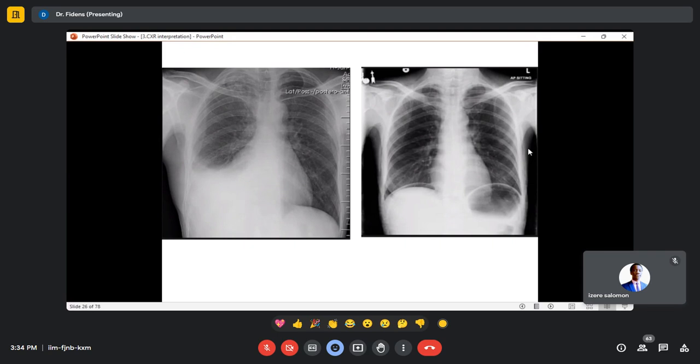under the diaphragm. Which diaphragm? Especially the left one. But how can you say there is air under the diaphragm? You have to mention that it is free air. Yes, it's very important. It's free air, and there is a systematic term which I use to describe that condition, called pneumoperitoneum. Yes, it is pneumoperitoneum.